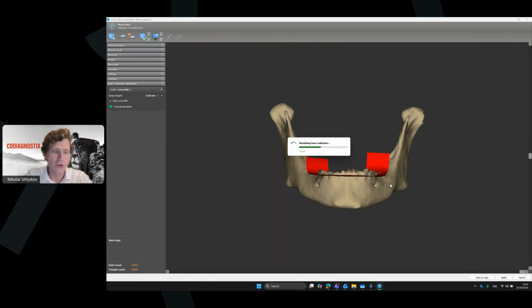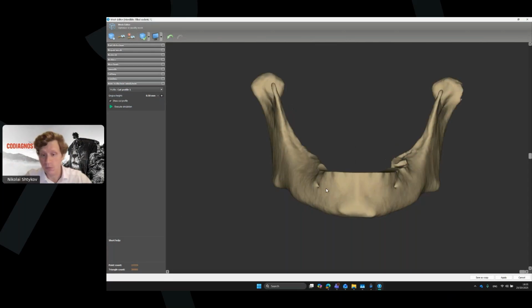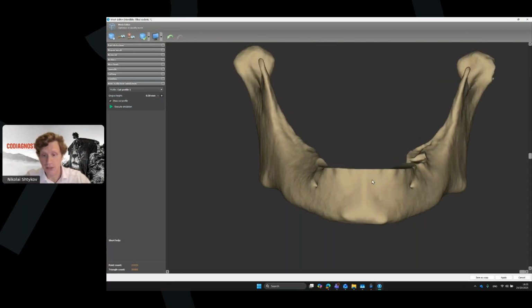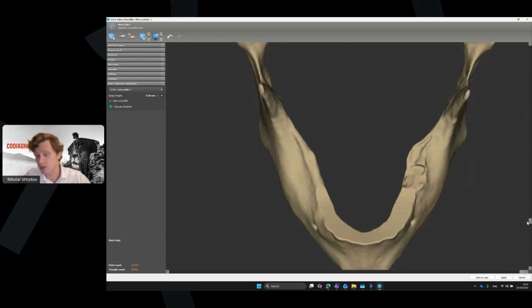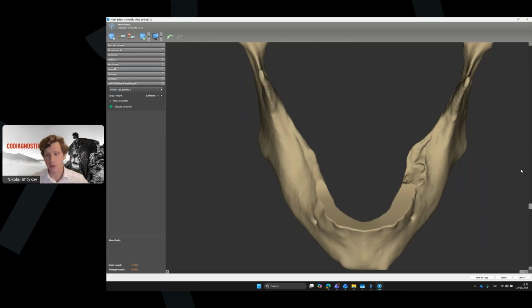Also in mesh editor, you can see the point count numbers. Here, this is how heavy our case is, and it is a little bit lighter than we had before. We have options here to reduce the triangles on this case, but you can see, so that's perfect. If you need to print this model, you can print it easily. You will not have these holes inside. You will have fewer issues.